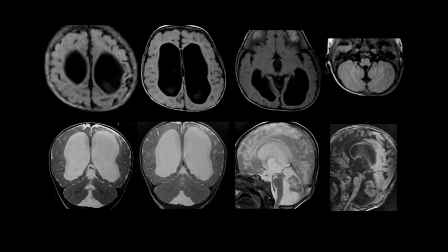To me, they can be explained very well, just like Nihaal has said. I think there is enough gliosis in that little rim of white matter that you see on the left side, on that coronal below, to tell us that there was extensive injury with relative sparing of the brainstem. That's why they're alive.